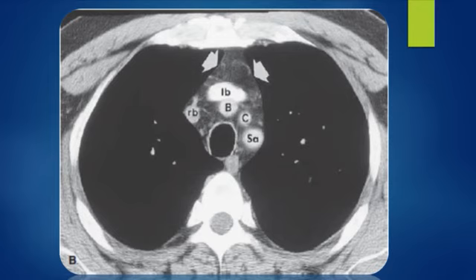Talking about the anterior mediastinum, the thymus is located anteriorly, which is seen as a triangular bilobulated structure. This structure usually involves fatty involution. So by the age of 35 years, it's mostly composed of fat with some glandular tissue. Mostly the left side lobe is larger than the right, and by this age it should have flat or concave edges.